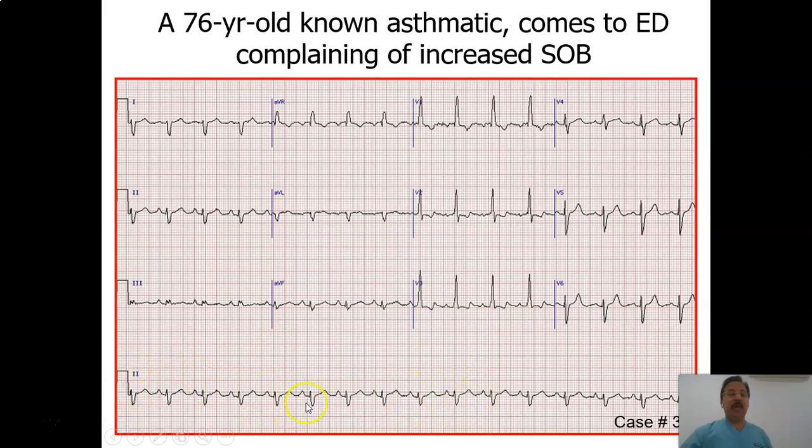It looks like a regular ECG, so we can apply any method for the rate. The rate is approximately 95, 90. For the rhythm, there is a P wave followed by QRS complexes everywhere, so it looks like the rhythm is coming from the sinus. It's a sinus rhythm.